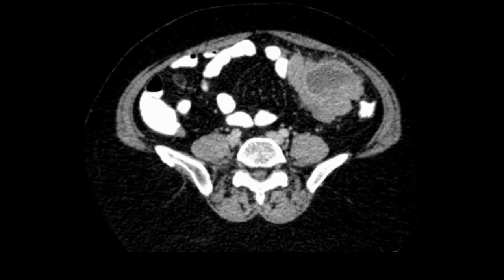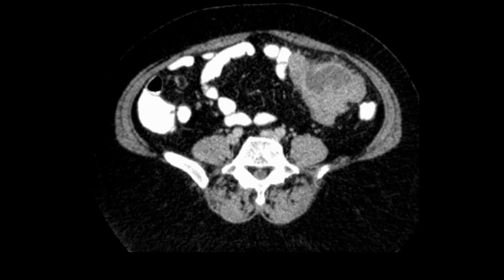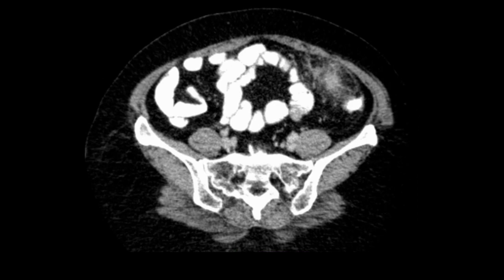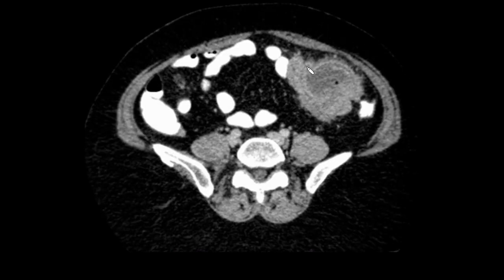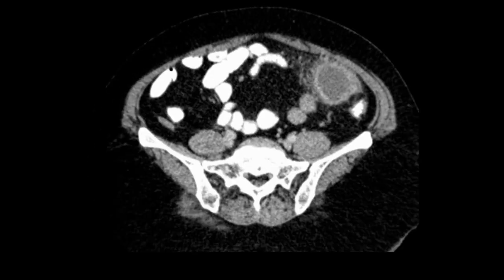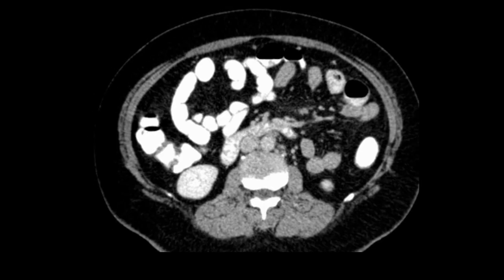But what is very important is that this is very difficult to make out in only the film. So unless you see the console, if you see only this part, you will consider this as diverticulitis, right? Or you will consider it as a mass arising from the colon, right? But if you see these things on console, they can be very easily identified, right?